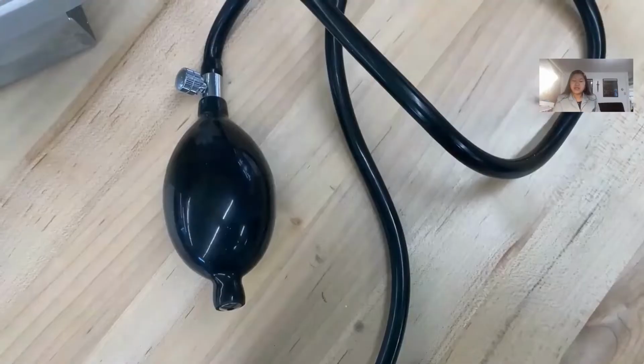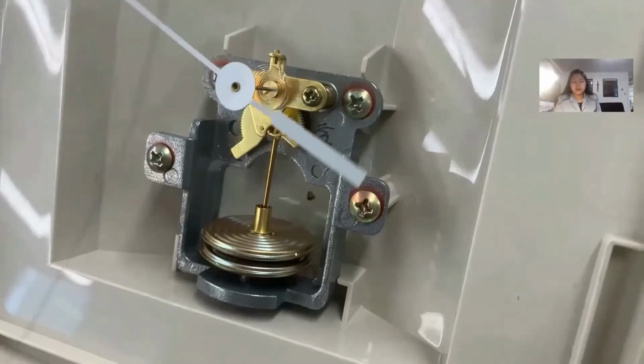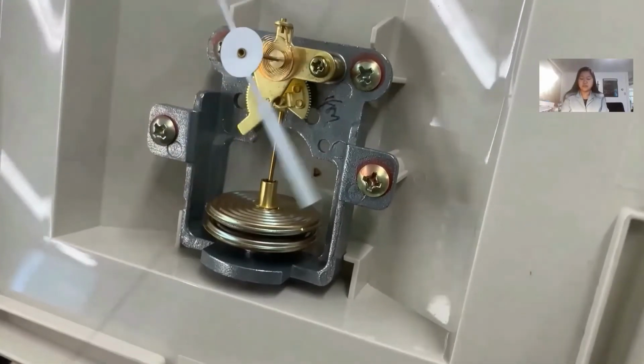You may recognize it. In a sphygmomanometer, the pressure is exerted by a small hand pump, which transfers into the cuff, which is wrapped around a person's arm. The pressure exerted by the person's bloodstream pushes against the tubing connected to the sphygmomanometer, putting pressure on it. The pressurized air enters the corrugated diaphragms, and they deflect with the pressure. The deflection moves the piston, thus turning the gear system, moving the needle.